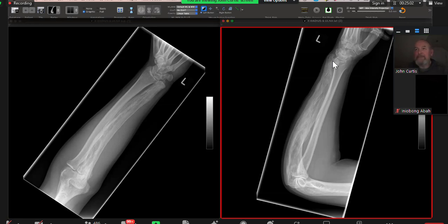I have been presented with left forearm AP and lateral views. I see that there is a generalized expansile lesion involving the left ulnar bone, causing deformity of the ulnar bone. There is also positive ulnar variance noted. The radial bone appears normal.